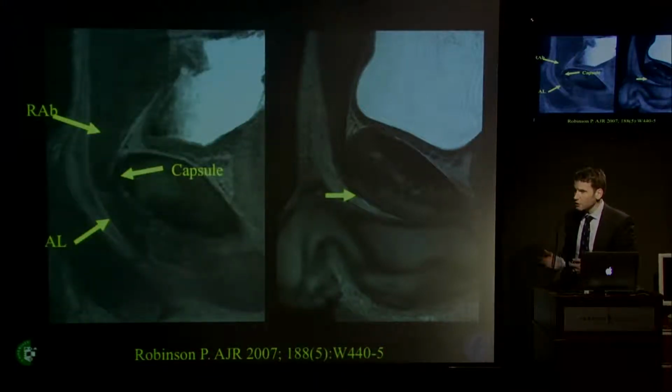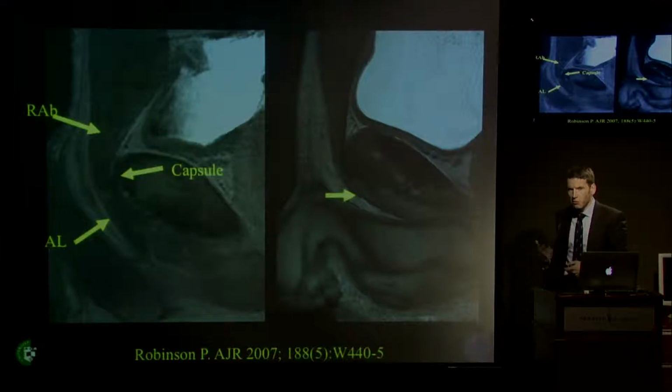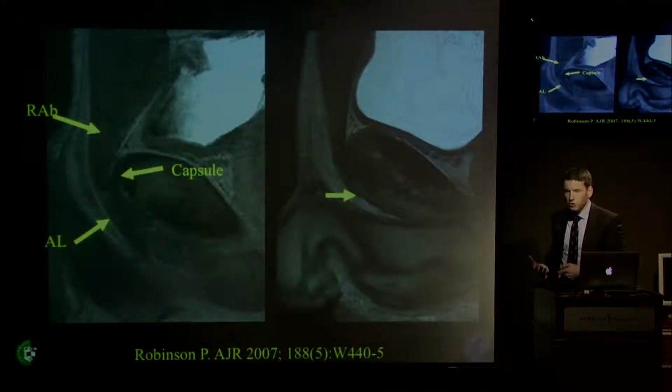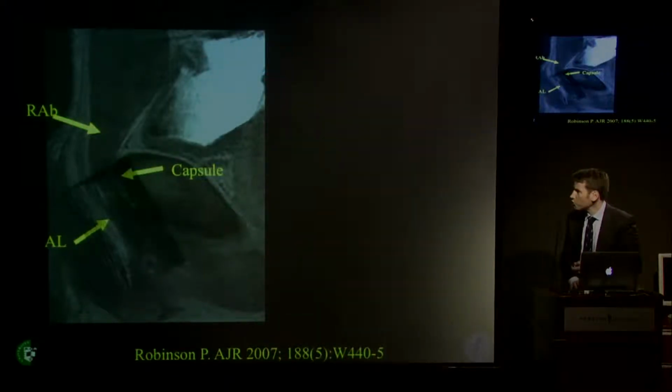If you go slightly sagittal to that area, you can then see that we have the bone, we have the capsular tissues here, and then we have rectus abdominis and adductor longus, again merging in front of this area. And this seems to be the main area, in my experience anyway, that we see the major abnormalities in symptomatic soccer players. If we take this analogy to the rest of sports medicine, typically where we see injuries or overuse injuries are junctional areas where different types of tissue merge, such as muscle and tendon and muscle injury. You can see this on ultrasound, but it's much more difficult.